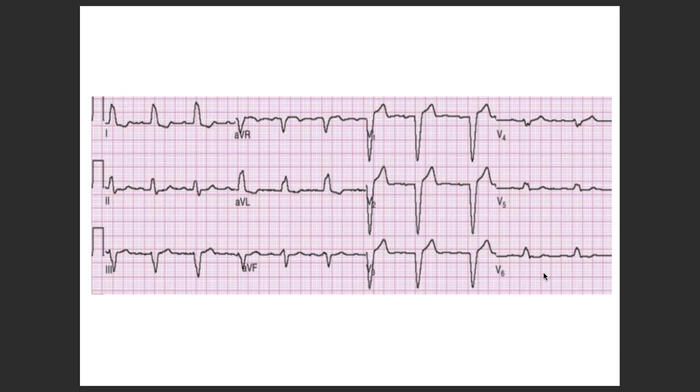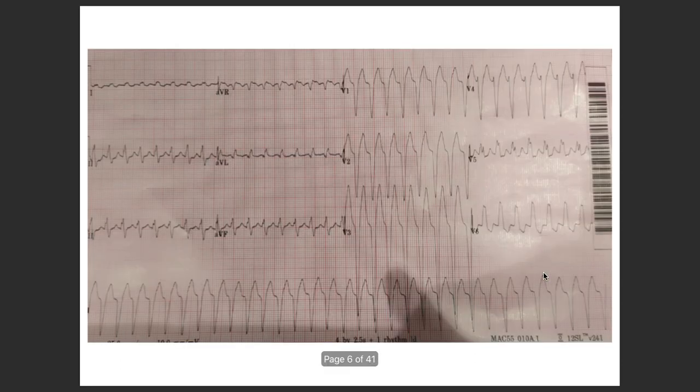Now coming to the ST segment or the T waves. It seems a little bit, as he already pointed it out, wonderful. Seems like ST elevation is there, isn't it? But if you will try to have a look over here, something is called as concordance pattern. Something else is called as discordance pattern. Anyone is aware of that concept? Okay, so if you will go into the next ECG, I'm going to give you one more.